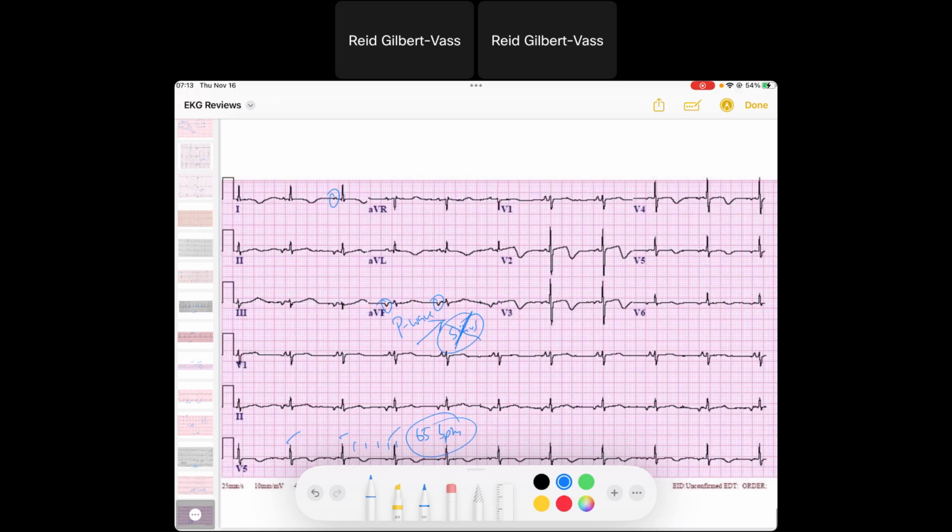so that's not a sinus P wave. It is not a sinus P wave. A sinus P wave would be going down and to the left. And so we would say that this is an ectopic atrial rhythm. And remember, the QRSs shouldn't change in this case because the AV node is just conducting the signal that it receives.